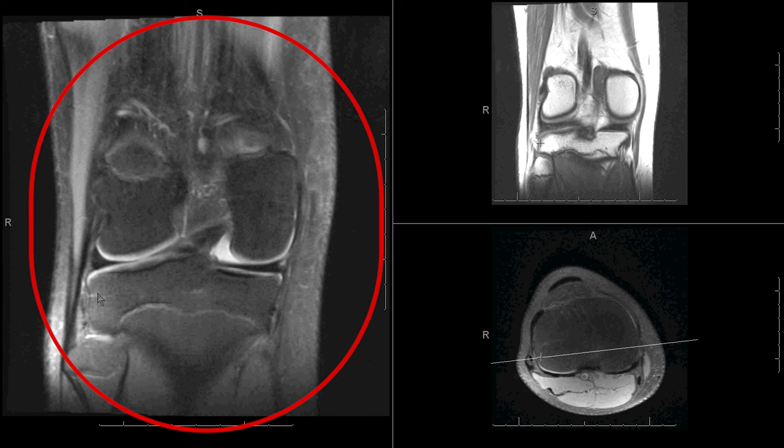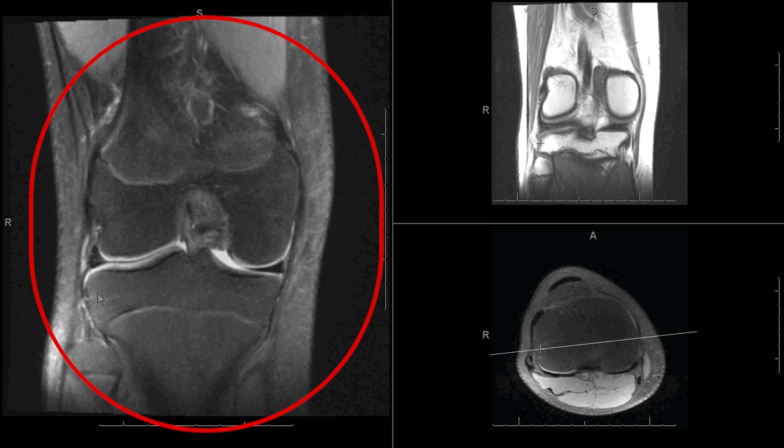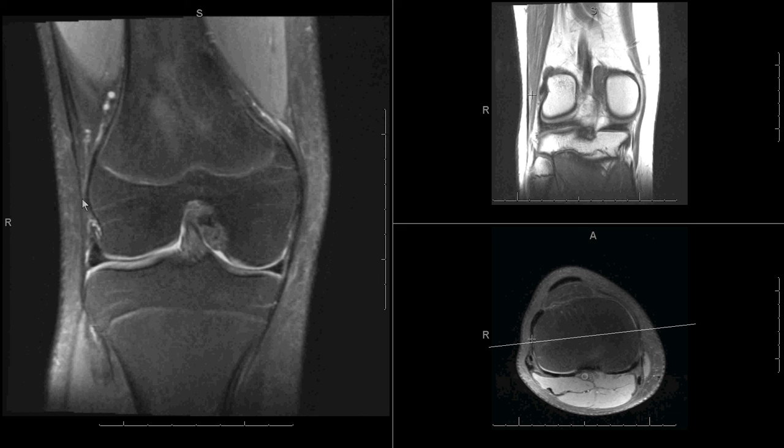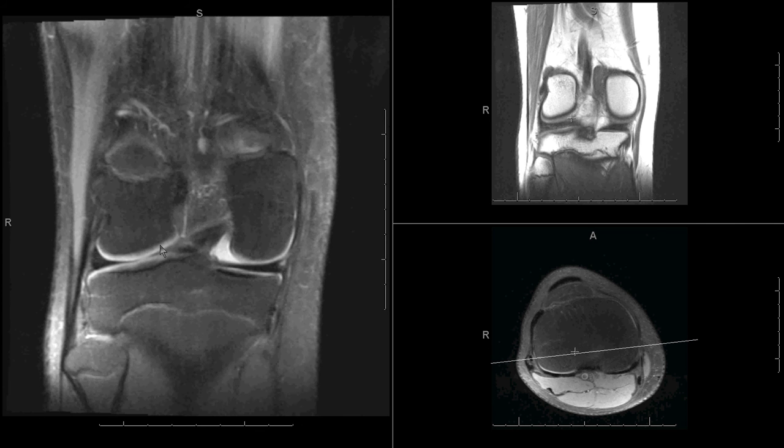Let's look at the lateral collateral ligament here, and it's really a complex of three structures. One is the iliotibial band. The other is the tendon for the biceps femoris muscle here. And then there's the fibular collateral ligament, which is here. And all three of those structures should be interrogated, and again, the same rules apply.